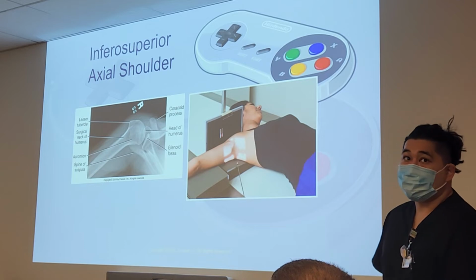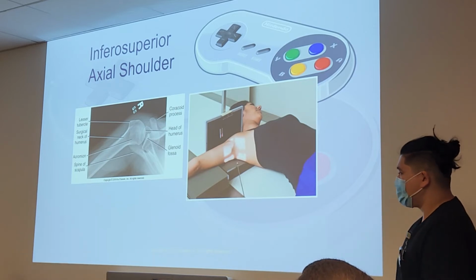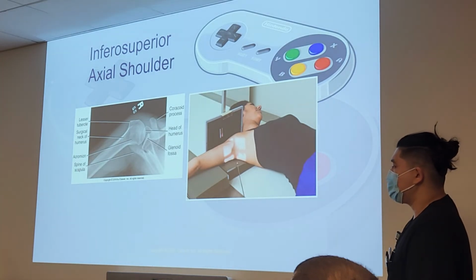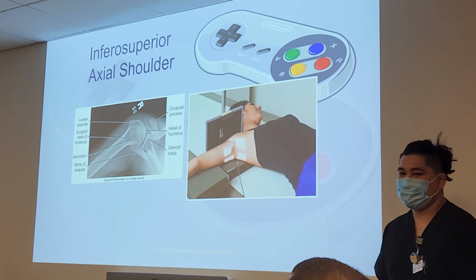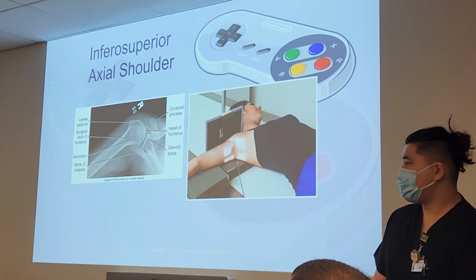Is that separation normal? That separation is the joint space. That's that synovial joint space that we talked about. So actually, it's not invisible. There's actually a capsule in there, a synovial capsule. You just can't see it on that x-ray. Where is all the fluid stored? Why doesn't it show up differently if there's fluid in there? Because it's actually invisible unless we add contrast to it.